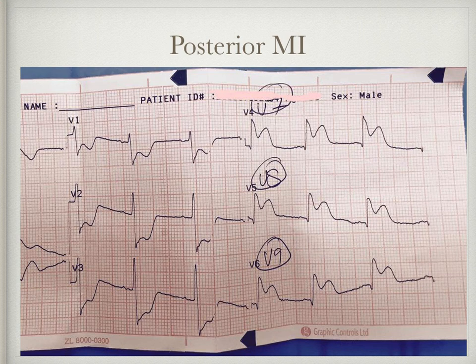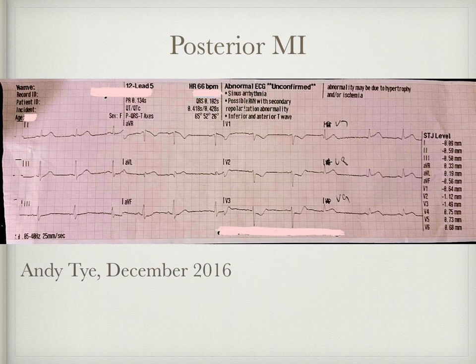To our third and final case from the archives then, and this one was for a female in her 60s complaining of crushing central chest pain which radiated into her jaw and was posted back in December 2016 by Andy Ty. We can see that this has posterior leads of V7 to V9 on it, and there is ST elevation in them, thus confirming the diagnosis.